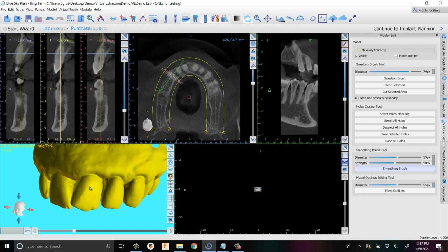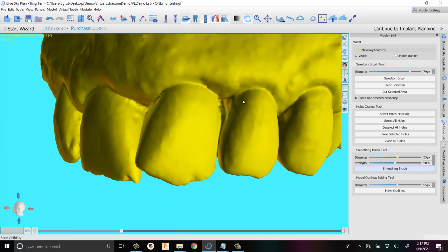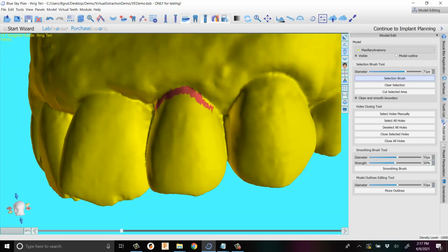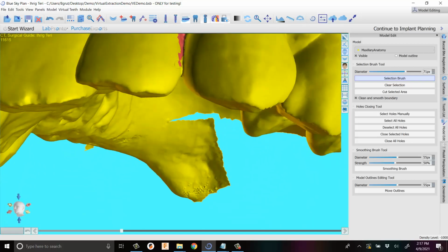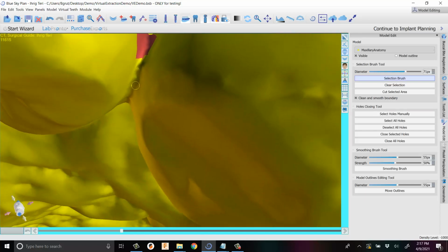Let's remove a tooth that's between teeth. That's actually probably a good thing to do, and I had thought about that before. So let's do that one more time, and you can fast forward the video if you want, but I'm not going to bother editing this portion. I'm just going to do it again, so you can either watch or fast forward. It's very easy to spend time being really tedious and finicky. Try to avoid that.